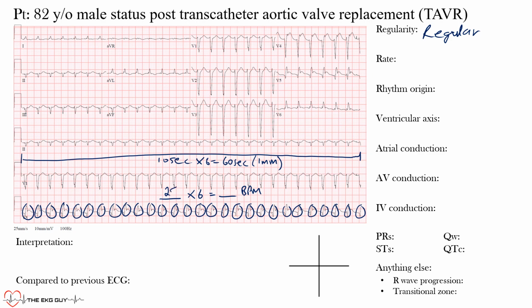What you want to do is 28 times 6. That's 168, so that's the rate here. As you can see, this is a fast, regular rhythm.